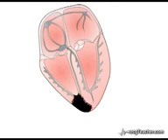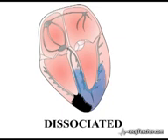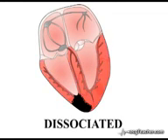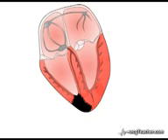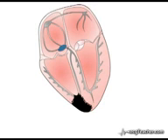Electrical events in the ventricles and atria are dissociated. The two regions are both doing their own thing, uninfluenced by one another. The presence of a capture beat in the rhythm strip is evidence of AV dissociation because, as illustrated here, it represents a rare P wave which has arrived at the junction at a point in time when the conducting system and ventricles are in a non-refractory state.